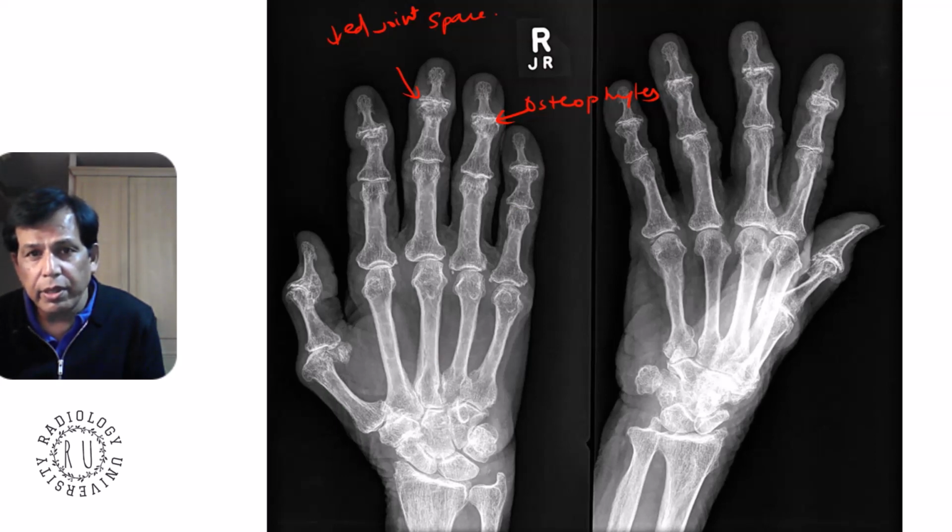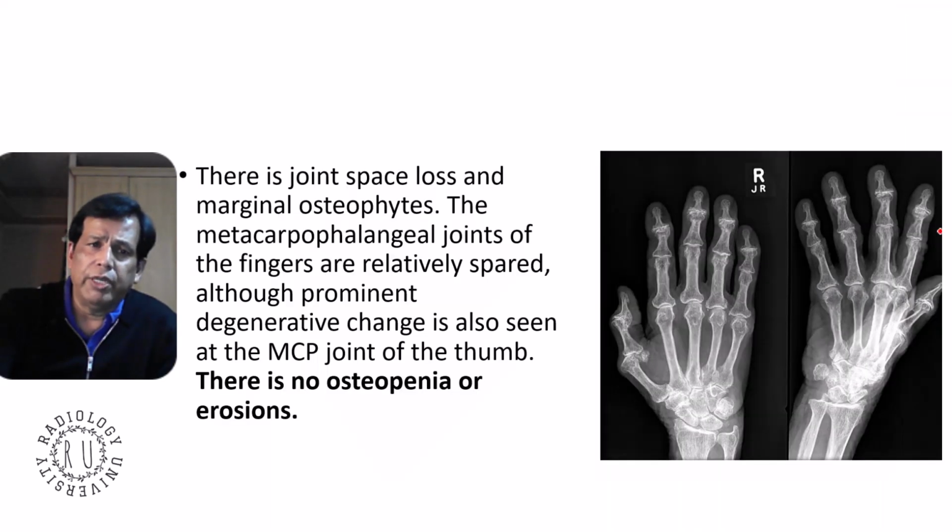With this non-erosion, loss of joint space, marginal osteophyte, and degenerative changes, no osteopenia or erosion.